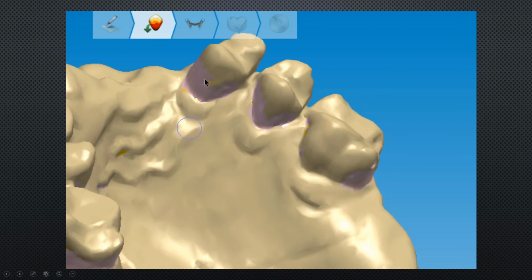And so you can come in and remove some of that block out to expose some undercut on the lingual, and then use that facial clasp as more of a reciprocation than a retentive option, and let them work together. So when you're designing, especially on lowers or different cases, don't ignore that lingual undercut, that lingual retention that you could possibly use.